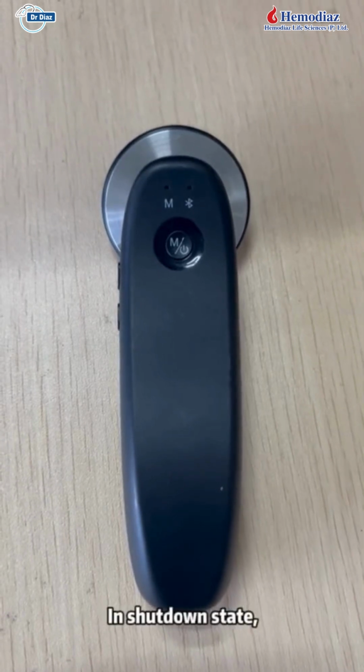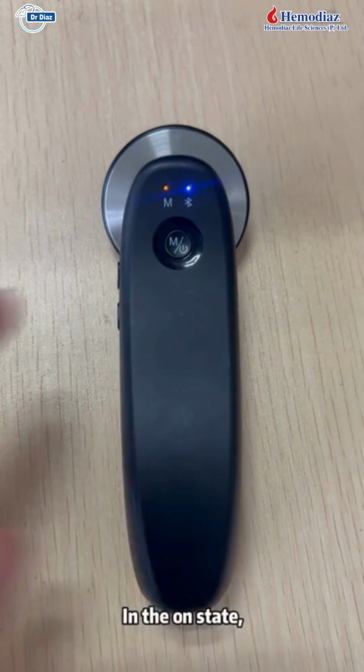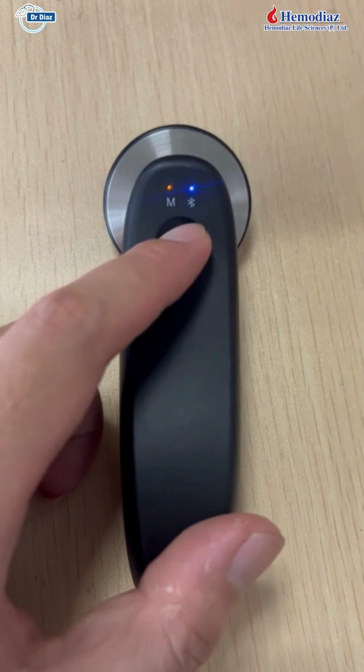In shutdown state, press the power button briefly to turn on. The default new sound mode has an orange light on. In the on state, long press the power button for 3 seconds to turn off. All indicator lights are off.